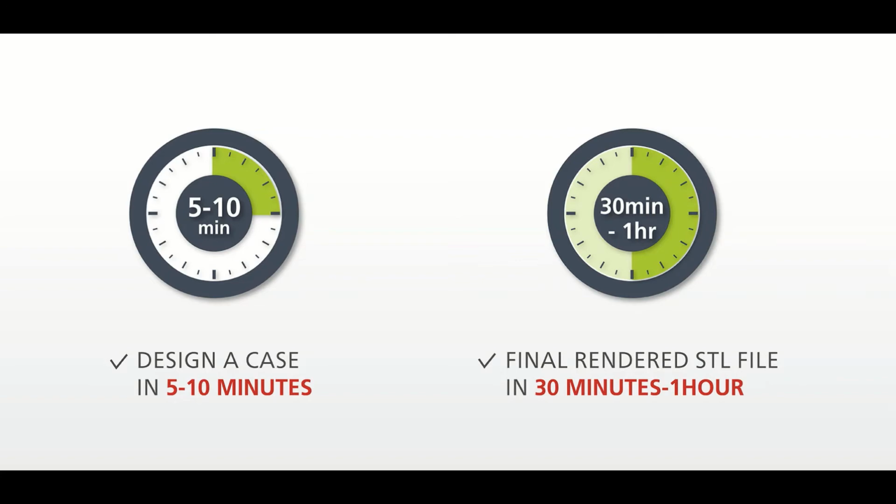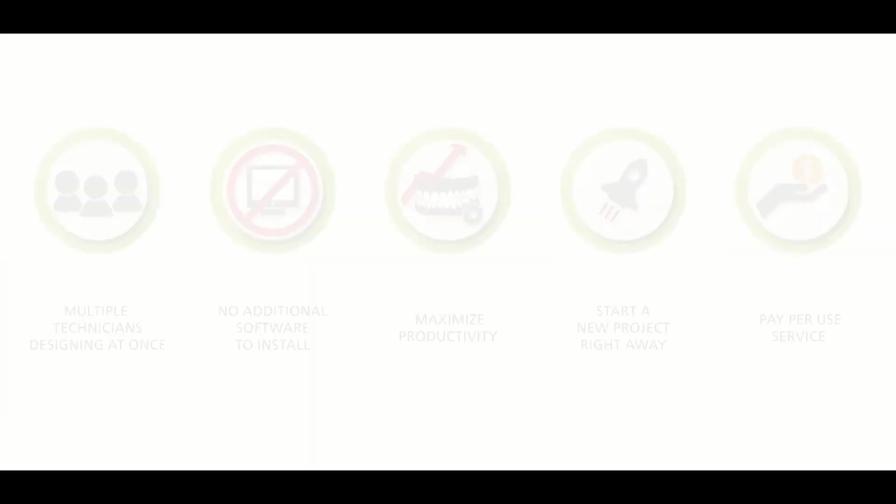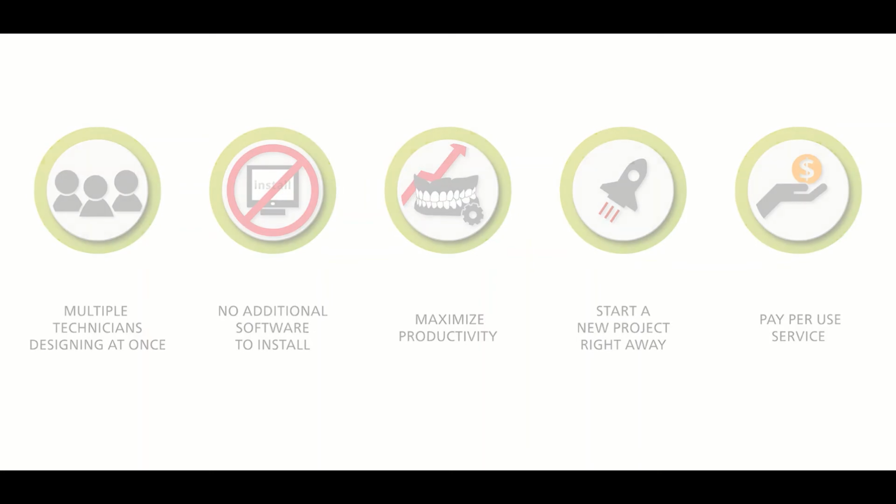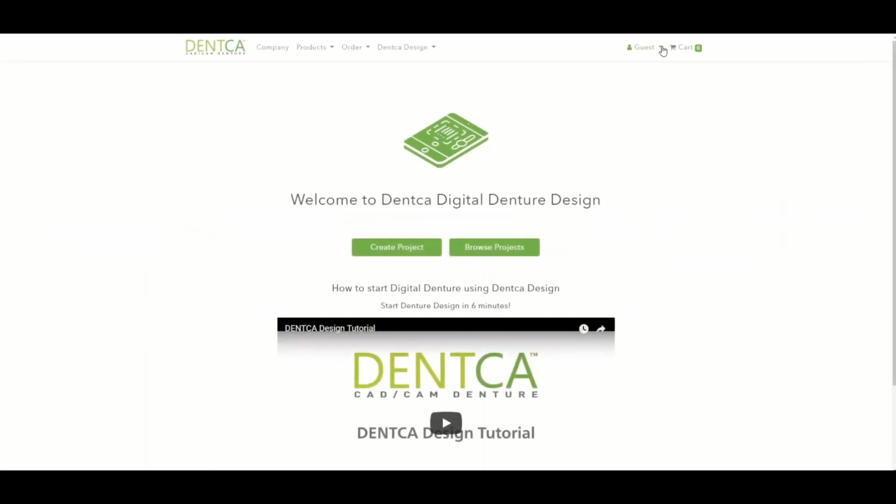Please note that by utilizing the DENTCA Design web service, you can have multiple technicians designing cases at once, without any additional software installation, thus maximizing productivity at your laboratory. While the cases are undergoing final rendering in our server, you can start a new project without having to wait for final generation. The DENTCA Design software offers you a pay-per-use service, which allows you to design cases for maximized output in 3D printed or milled formats in a simple and efficient way.